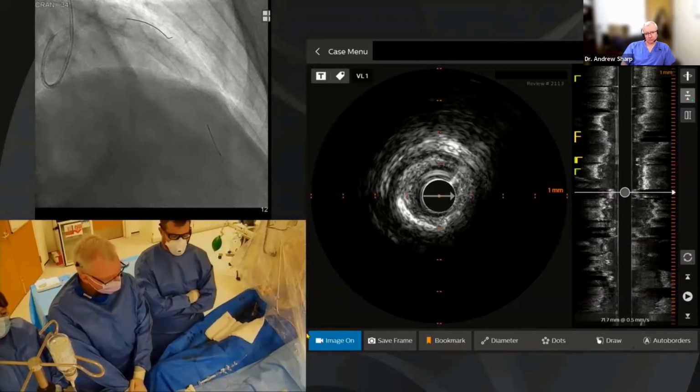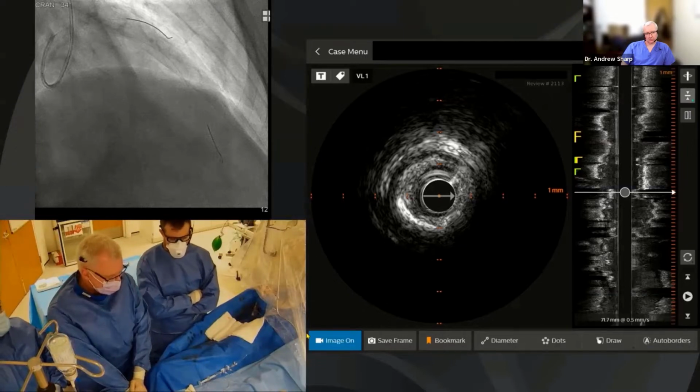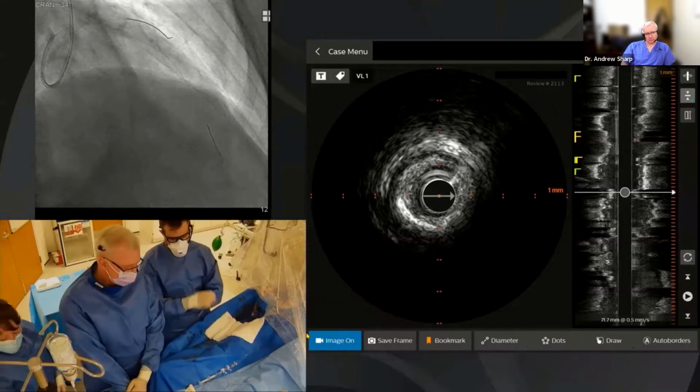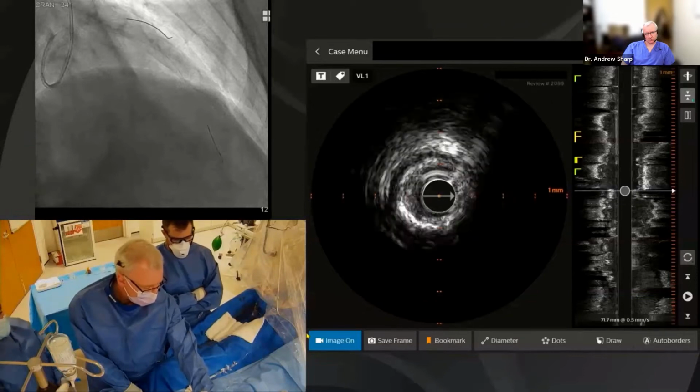So what do you think? I mean, this is not what we expected to find. Well, I think we've got a tight lesion. There's a bit more calcium in this than I ever thought. Yeah. But actually, most of it's intimal calcification here in one quadrant. I think as you come further back, there's a bit more calcium. So we got quite a lot of dropout, haven't we?